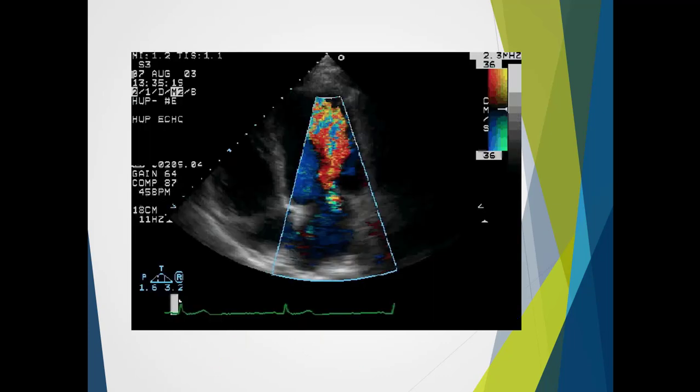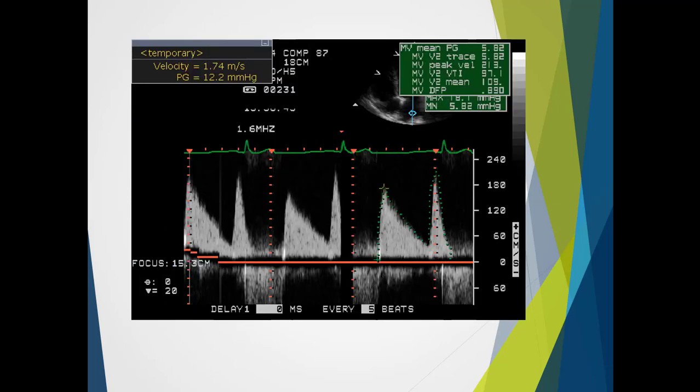In this example here, we can see colour flow of blood moving in from the atrium into the ventricle. So a radius would actually be measured from the leaflet tips to the first level of aliasing. And in this one here, we can look at the forward flow through the valve. Now it's important to note that even though the atrial component has the higher velocity, the velocity we're actually going to measure is from the early diastolic flow.